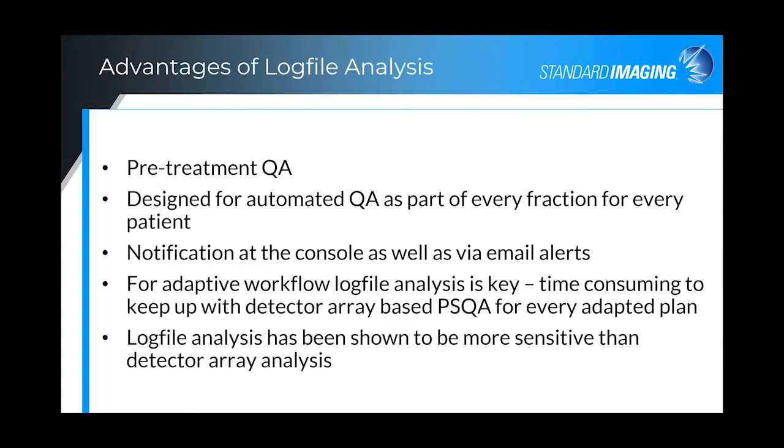So, advantages of log file analysis. Of course, you could use it for pre-treatment QA, but really, the software is designed for automated QA as part of every fraction for every patient. You could use it for both functions if you so desired, but the real design intent is for every patient every day. You get automated notification on the console as well as email alerts.